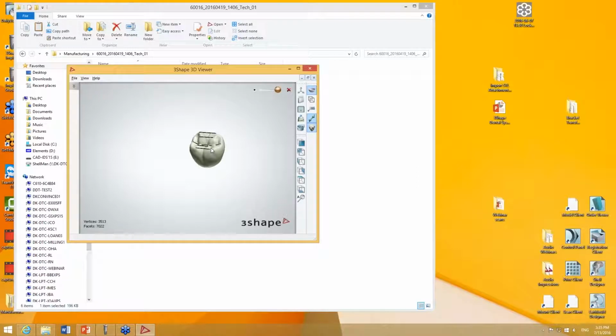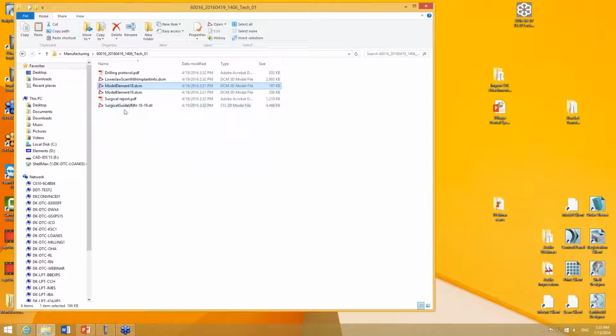You can morph your design back in dental system to basically copy the same position. Of course, knowing dental system really well, you probably know that if there are more positions like this, there's only a limited amount of surfaces that we can import into dental system.